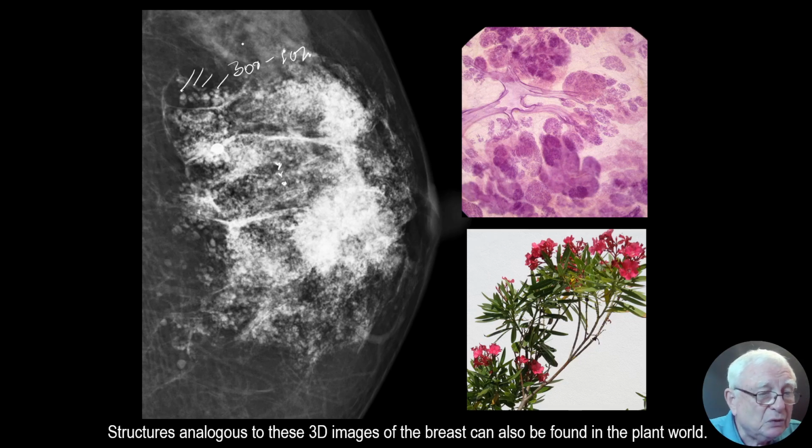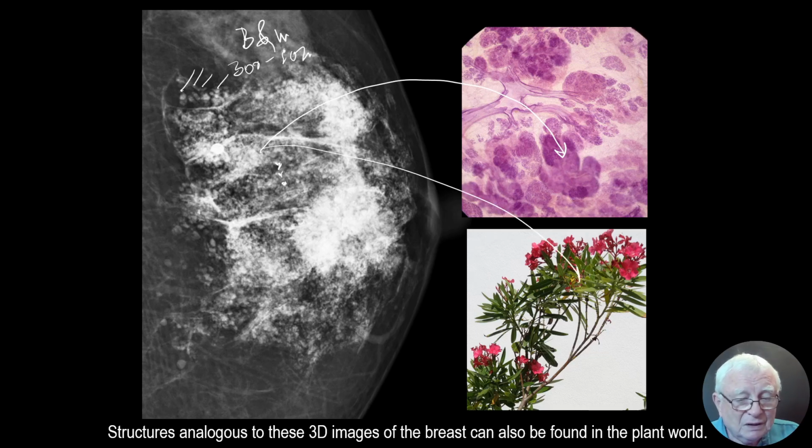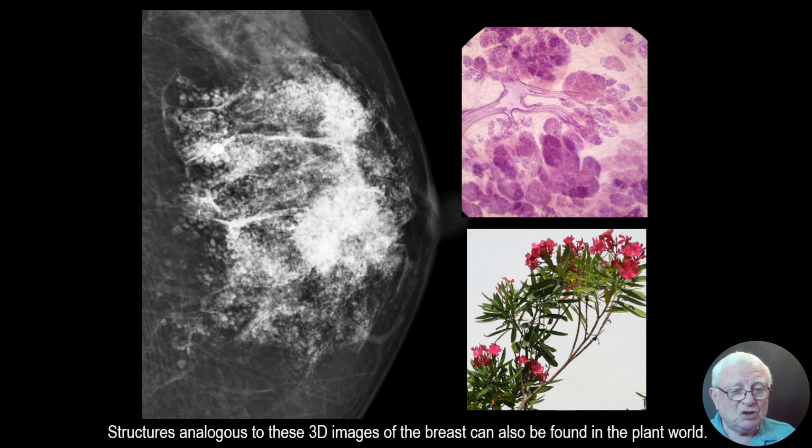And as soon as you look at the black and white, please think about this. And think about this. Then imaging becomes an art. And this is a duct. And this is a duct. But most of the densities are TDLUs.